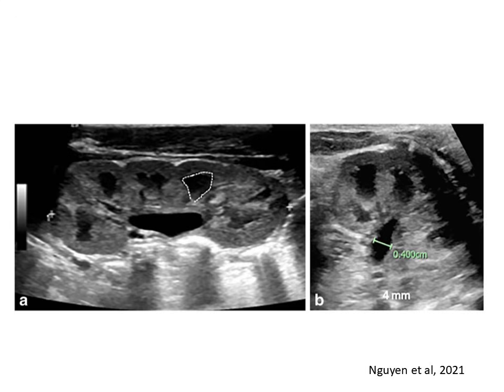Urinary tract dilation, UTD, classification P0, normal. A, B, sagittal, A, and transverse, B, ultrasound images of the right kidney in a 23-day-old boy demonstrate right pelvic distension with the anteroposterior renal pelvic diameter measuring 4 mm. The calipers mark the upper and lower poles of the kidney. The APRPD is the widest intrarenal measurement in the transverse plane.